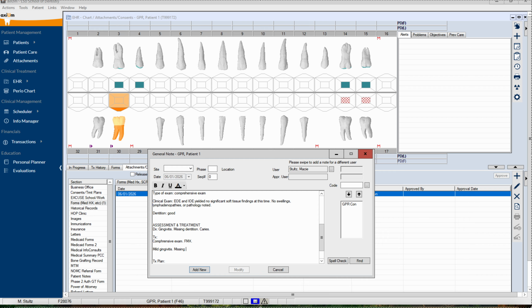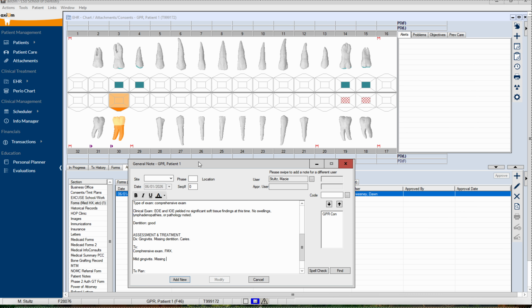So here I'll just put the important things. So his is pretty straightforward, like occlusal caries, missing 20, missing 29, right? So missing 20 and 29, 30 and number 31 have shifted mesially into the space.